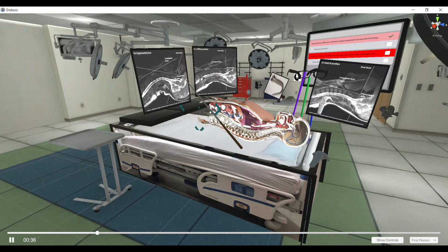I'm going to pull this picture over here so we can demonstrate the neutral position on our anatomic model. So you have your oral axis here. You have your laryngeal axis here. And then you have your pharyngeal axis here. And through patient positioning and direct laryngoscopy technique, you're trying to align these three axes as much as possible so that you can obtain a direct line of sight to the vocal cords and glottic opening and thereby intubate your patient.